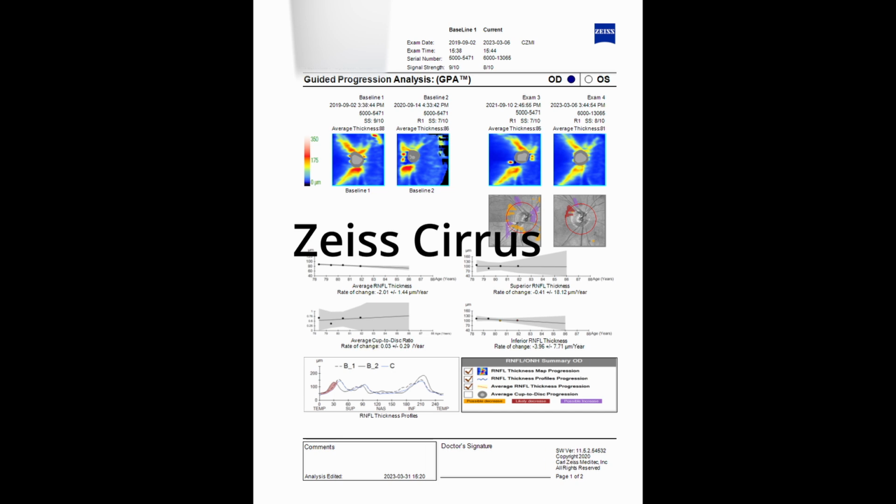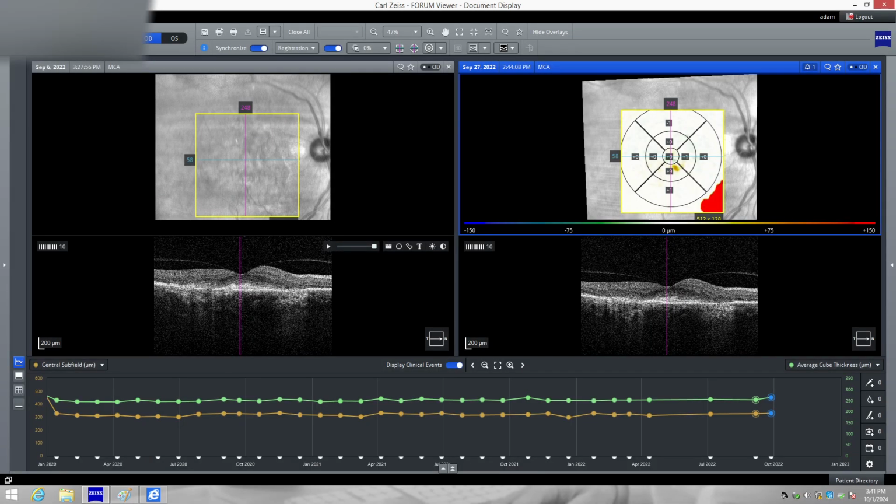This is the analysis of the RNFL for the glaucoma. It's also very unique because it gives you the confidence interval for the progression, so the predicted progression of the patient. Extremely useful. And this is partially why we didn't buy Glaucoma Workplace, because we decided, well, we have the GPA, so why would you buy Glaucoma Workplace, right? We can have the Document Display for the visual field and then the Fundus Photo or the SLO, which with Cirrus 6000 is pretty good, the SLO, so you don't really need the Fundus Photo. At least this is what we say to each other.